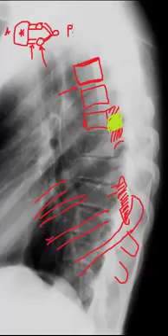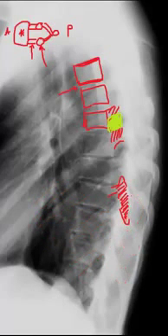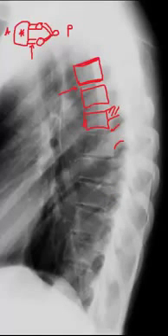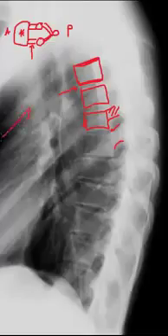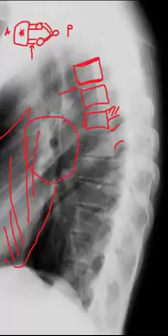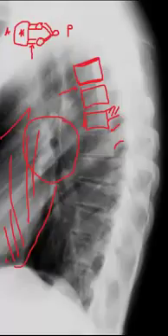Now there are some other soft tissue structures that are very well visualized, and let me just back up quite a bit here so that you can have a clear visualization of these structures. All right, now coming back to the mediastinal region, this is the heart. This is the hilar region, where our pulmonary arteries, pulmonary veins, and mainstem bronchi enter and exit the hilum.